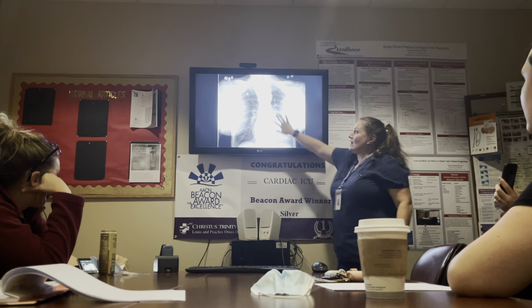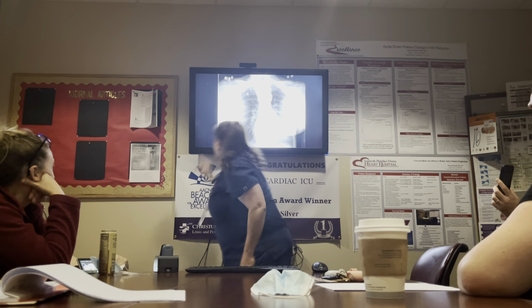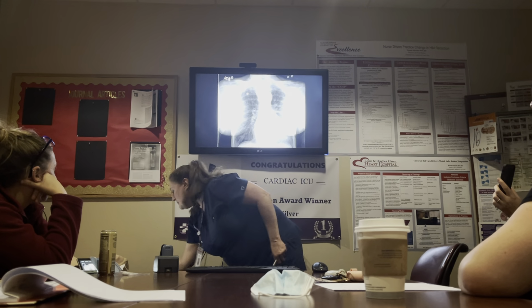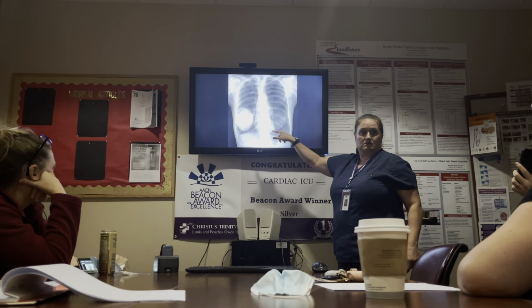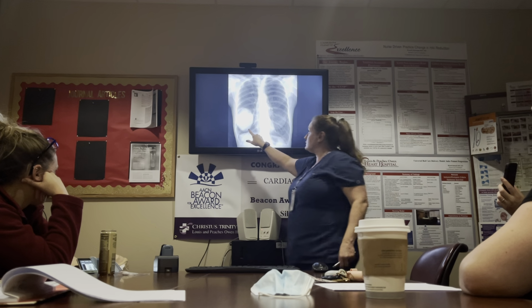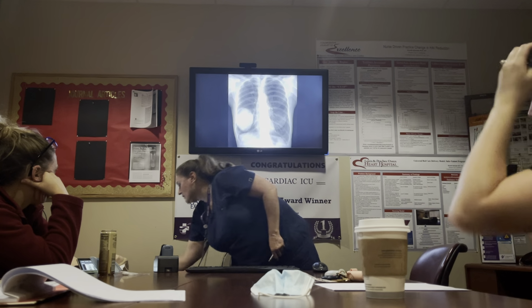These are outside the chest wall. And you can actually see the lines there of where that is. And you can see that this is inside the chest. So that's a pretty bad situation. Same kind of hyperexpanded lungs though. It was just that this is inside the chest.